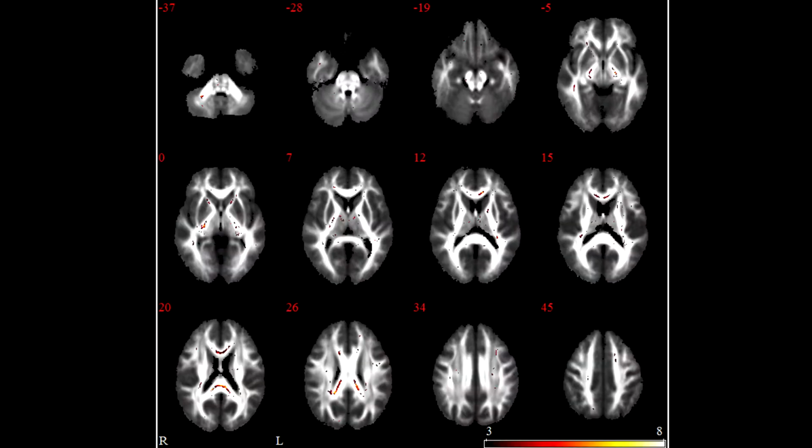And what we're looking at now is his DTI image. What we've done is a voxel-wise, actually, I'm sorry, this is a tract-based analysis, and what we've done is compare ZD to a number of healthy controls, and from there created a statistical map. We've thresholded the statistical map using a T statistic of 3 or higher.